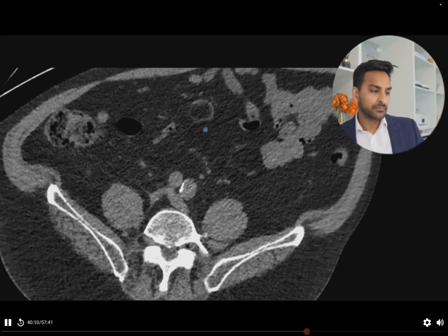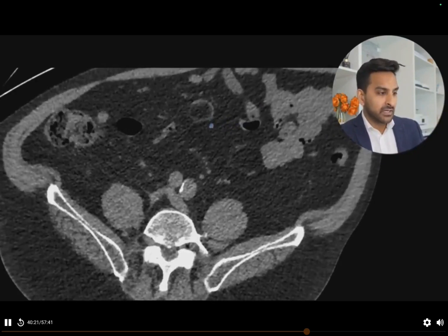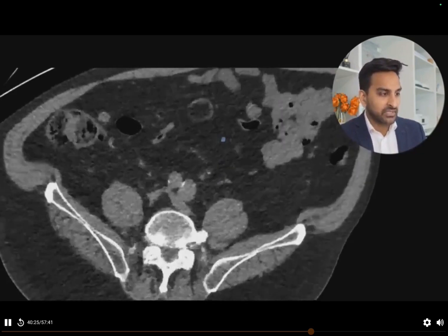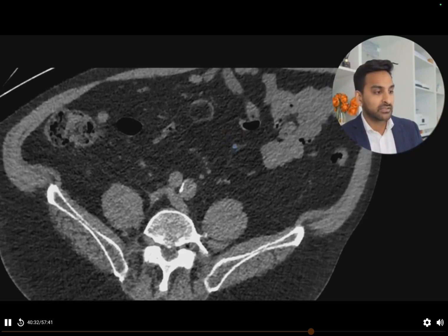And so on the anti-mesenteric side, what we have here is a very hyperdense rim-like structure, and you've got someone who's got this sort of abdominal pain. Now, sometimes you actually see a very hyperdense dot within the middle of it, which would be indicative of a thrombus. I don't think we can see a thrombus on this one, but this would overall be in keeping with epiploic appendagitis rather than a renal stone causing this patient's problem.